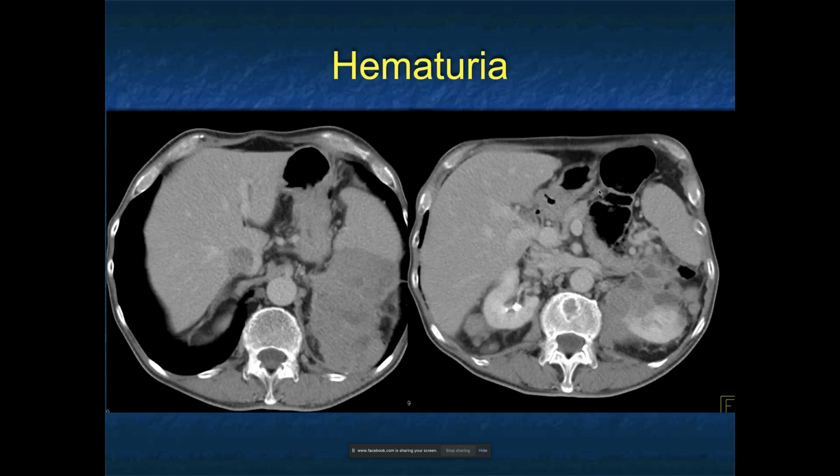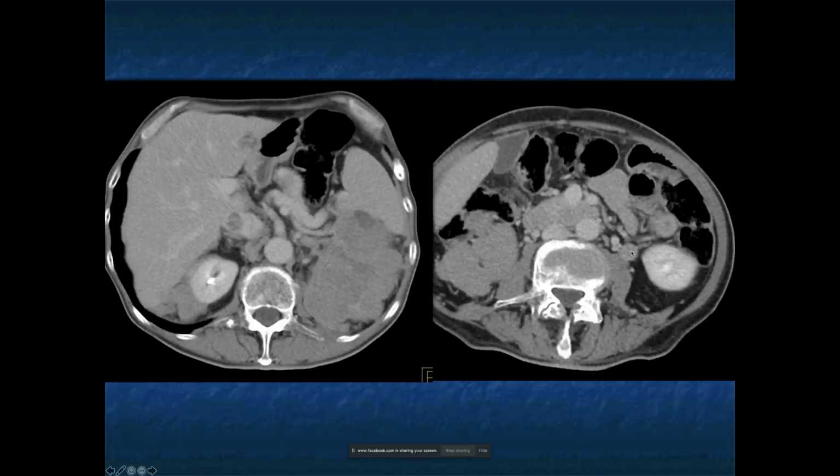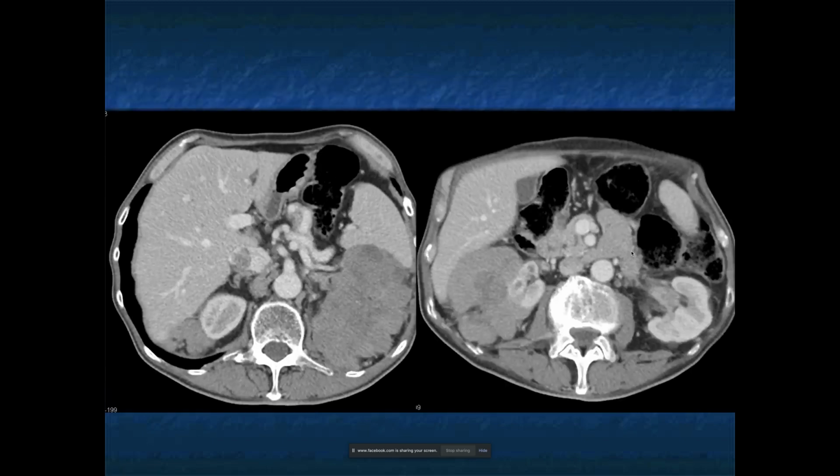What you see on the image on the left are tumor masses. Something's infiltrating the peri and pararenal space bilaterally. So it's not the look of a renal cell carcinoma, it's something outside growing in. The first thing I would think about would be lymphoma. Perirenal space involvement, bilateral, very good for lymphoma. There are also nodes present, that's really good for lymphoma. And here's some more images, really extensive, bulky tumor.